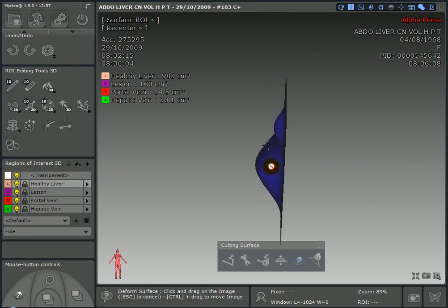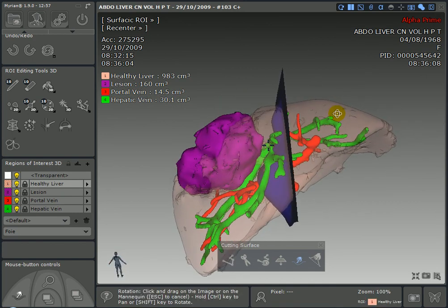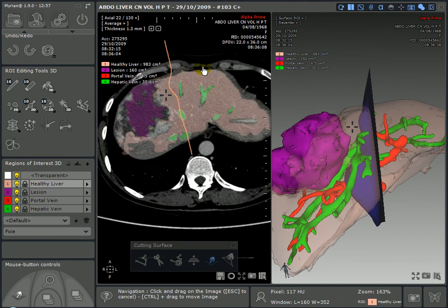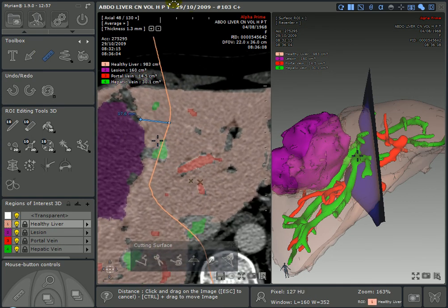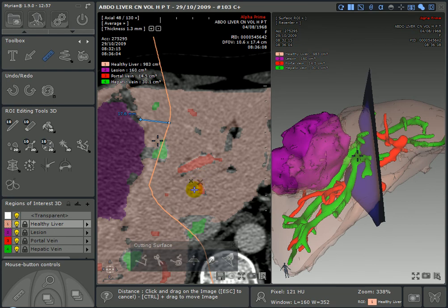And look with the liver. And I also cross check with 2D reading. So we have this orange line that follows the 3D interpolation. I can also go and decide to measure annotation. Make sure the safety distance is okay. And when I'm happy with all my planning, I just decide to run the surgery.